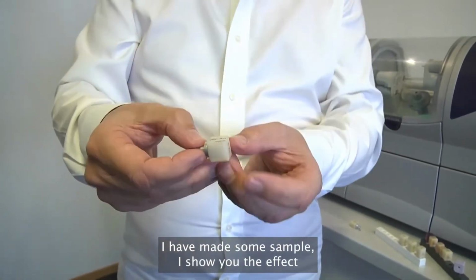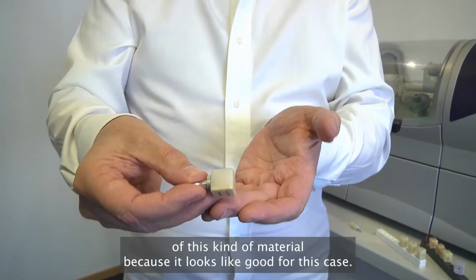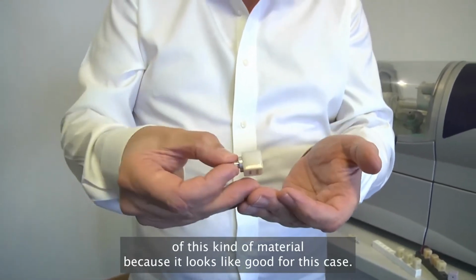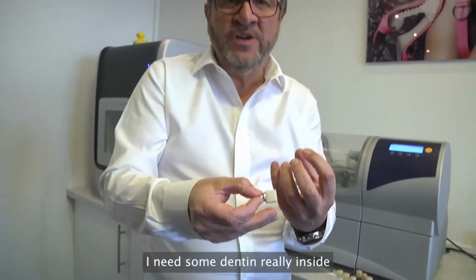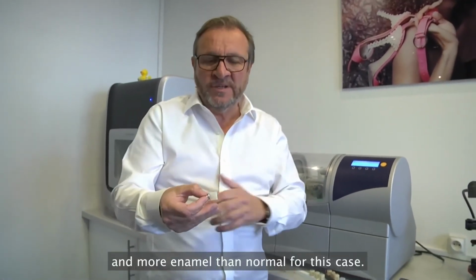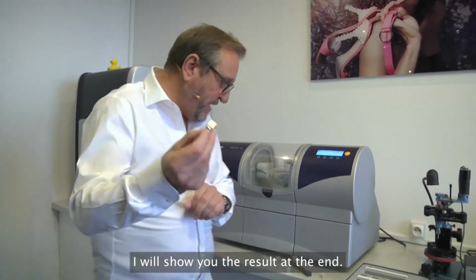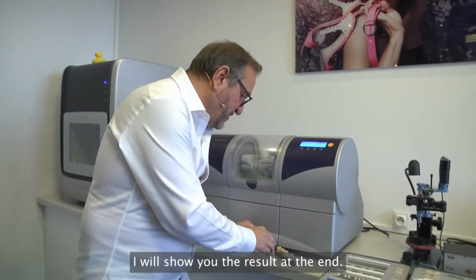I have made some samples. I show you the effect of this kind of material because it looked good for this case. I need some dentin really inside and more enamel than normal for this case. So it could be good to have a good result with that. I'll show you the result at the end.